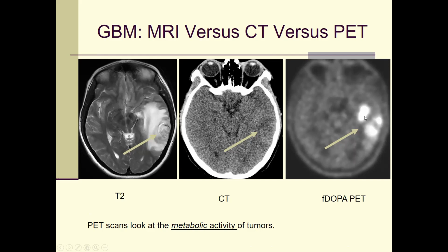Now medial to this, there's some other extra activity here, which is not detected by the MRI. So there's another tumor hiding within this bright signal, because this component of the tumor has a different characteristic. This tumor is non-enhancing and hidden inside this edema. So the PET was able to help detect this tumor within the hidden activity.